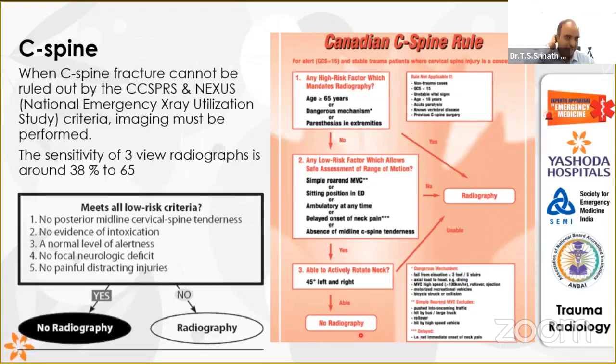Next. So again, continued. You see here how you have to look. When you ask for an open jaw X-ray, you have to look not only at the jaw, but the C-spine also. So like this, you have to look. See here, again, contour. Look into the contour also. Then you will not miss any kind of fracture.